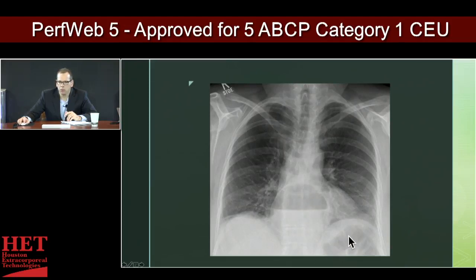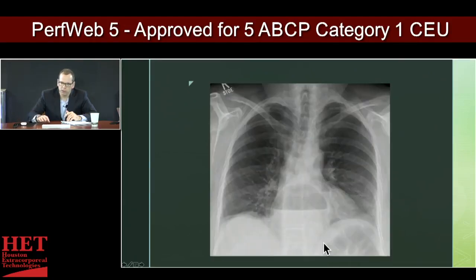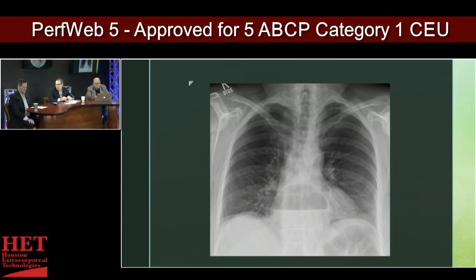This is going to be colon that's up under the diaphragm. Normally this is where you would see the gastric bubble, the spleen, they all live in this area, not colon generally. So that's one of the abnormal findings you would see with this, and this patient could probably come in with chest pain. They've been worked up for myocardial infarction, they've probably had a CT scan for possible PE because of the pain, etc. And they have a hiatal hernia.